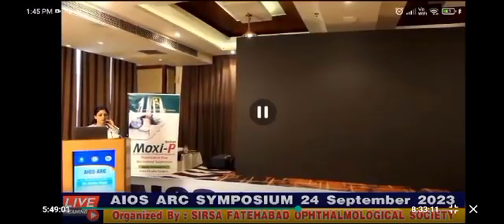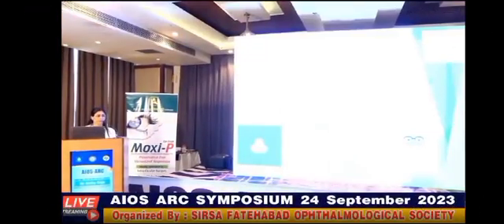Dr. Aastha. Step-by-step interpretation to read Humphrey versus Octopus visual field.